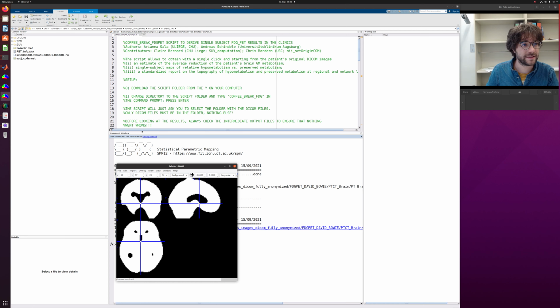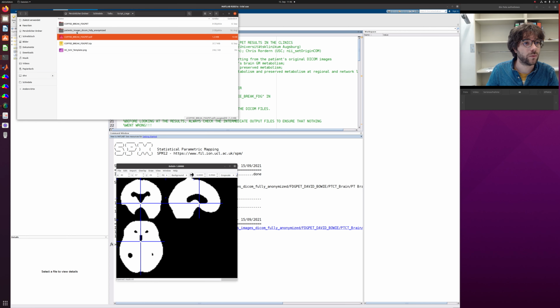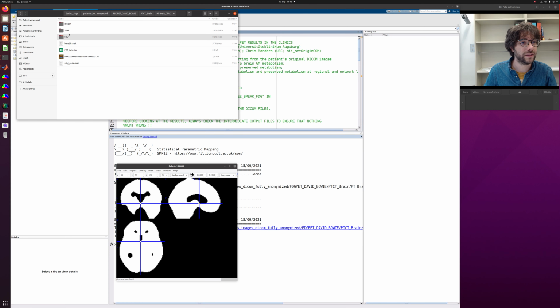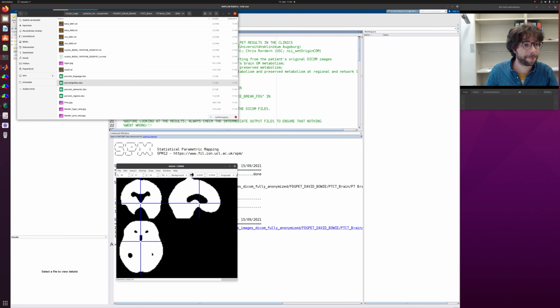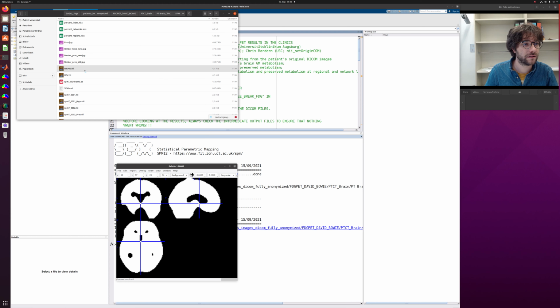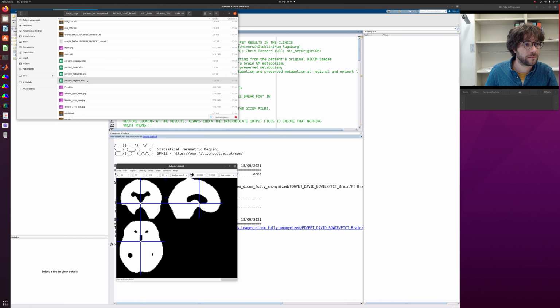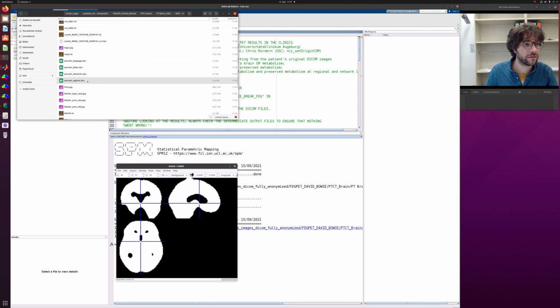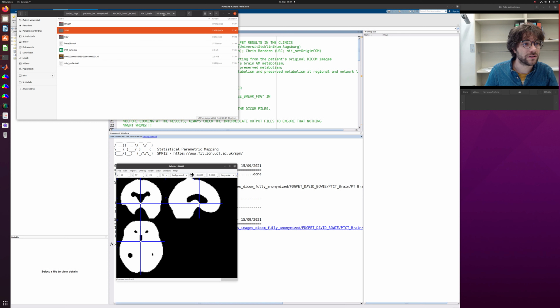And as a second step, we can see if the co-registration worked well. So I am again opening, go to SPM, and this should be seen, or was it here?